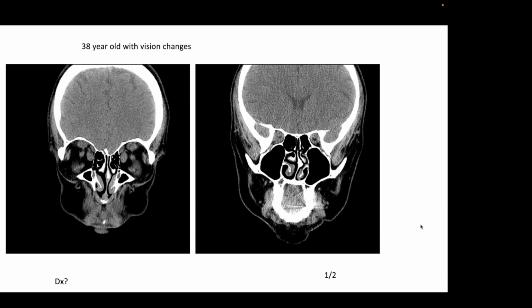Marina, what about this case? This is a patient with some vision changes. Muscles are abnormal, yes. Oh, sorry, Marina. I don't like the muscle. I think the orbital muscle is thicker than usual. It's my opinion. In this case, I will do MRI with STIR images to be sure that all is okay here.